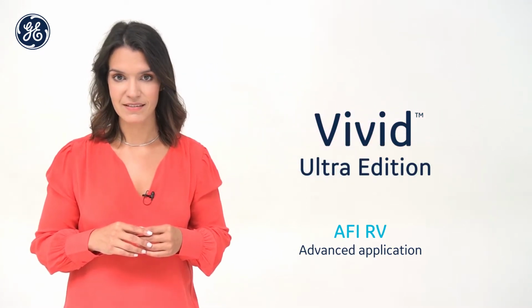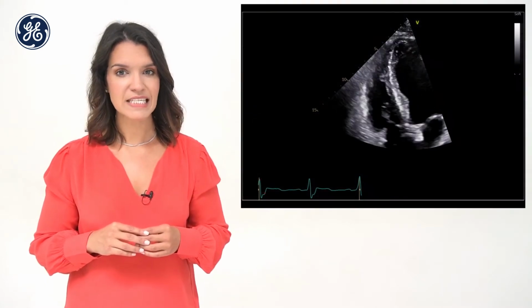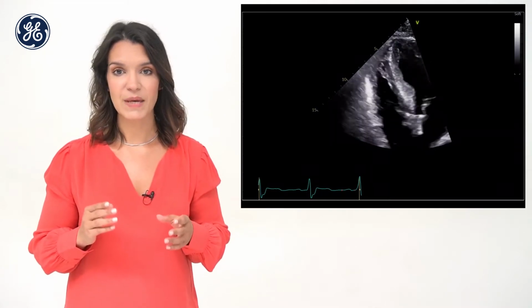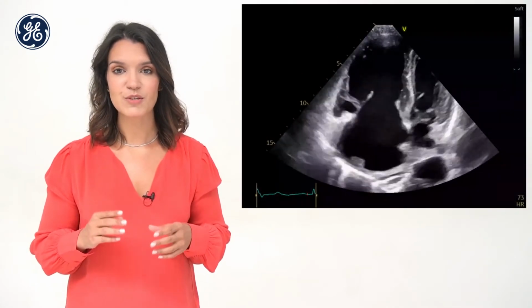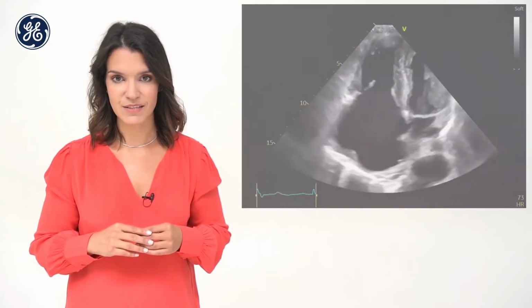in your practice. Right ventricle systolic function is an important prognostic indicator in patients with cardiovascular disease. Its assessment can be challenging due to its complex shape and anatomy. Using traditional echocardiography requires incorporating multiple parameters along with visual assessment as a common method of interpretation.